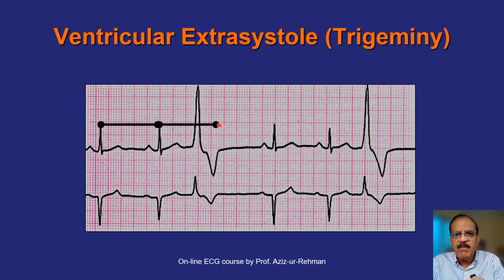Why did it not come? Because of this ventricular depolarization, which depolarized the ventricles but did not enter the atria. Atrial depolarization here could not produce a QRS complex because the ventricles were refractory. So a sinus depolarization of the ventricle was dropped here, because for the atria it is as if nothing happened. The next atrial beat would be expected at its normal time. So the next QRS will come at its normal time. Since this longer interval compensates for this shorter interval, it is called fully compensatory. This is the traditional explanation.